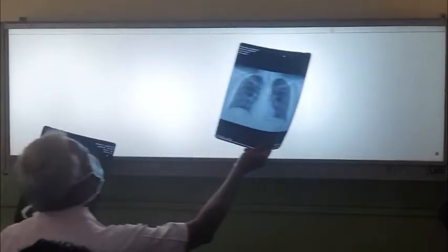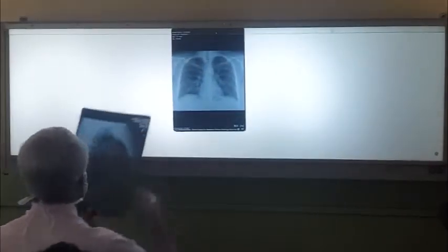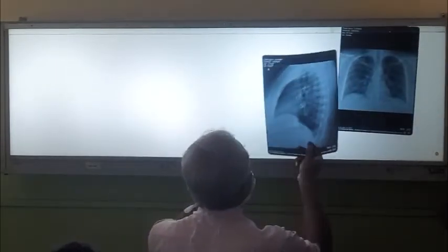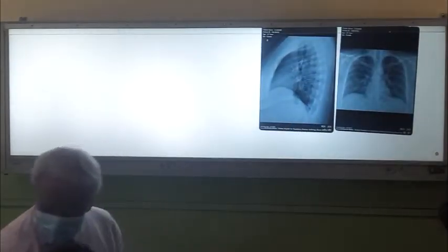Just listening, right? Just listening because I'm not a radiologist. I'm just going through some X-rays, right? Sorry, all right, no problem. So I'll show you some X-rays, and after that, when you see an X-ray, just try to describe the X-ray the way that I'm going through these X-rays. Okay.